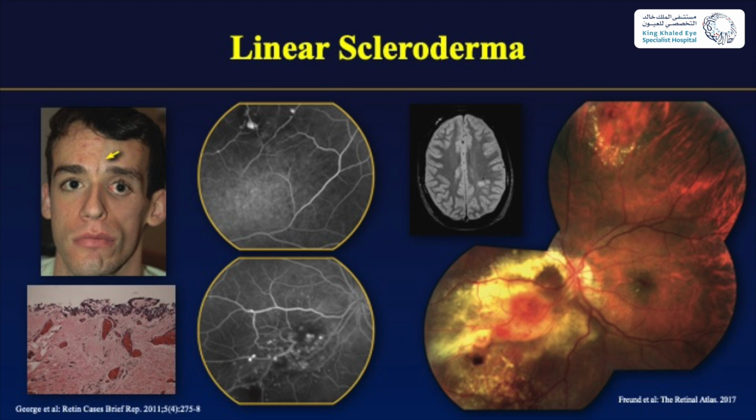In his fundus photograph montage, you can see the extensive lipid exudation nasally with vascular abnormalities, and you can see also clearly in his fluorescein angiogram the light bulb appearance, the abnormal blood vessels, and in his MRI he has a vasculitic lesion in the parietal lobe.